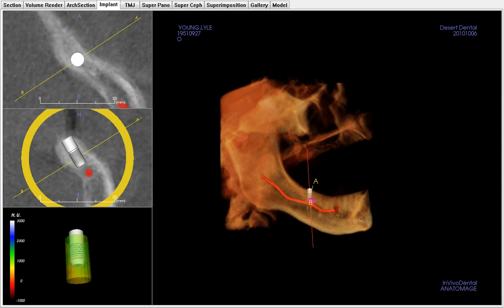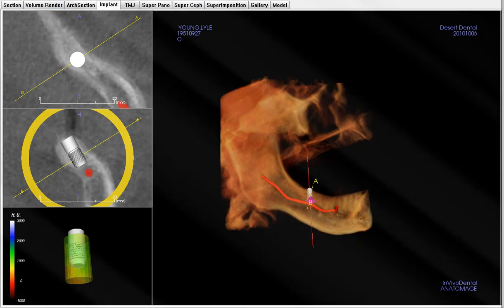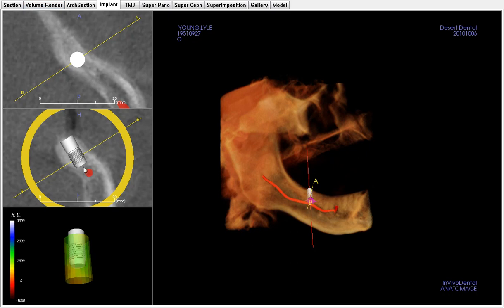Now Astra's shortest one is 4x6. I would probably choose that type of implant, 4x6, since the 8mm is, in my opinion, too long. I'd rather have a little bit more freeway here, even though we can measure the distance here, about 1.75, 1.67, and this is at 8mm. So if we go with a 4x6, we'll probably have more clearance.